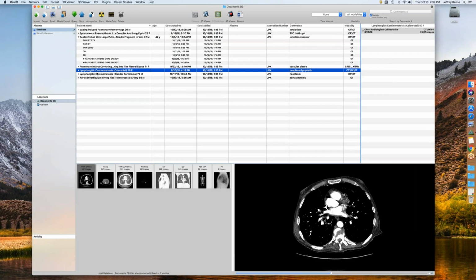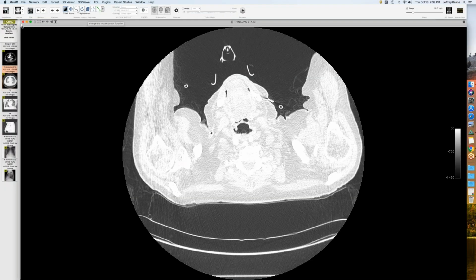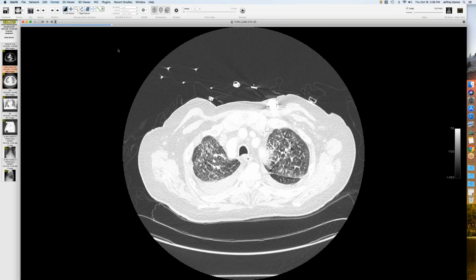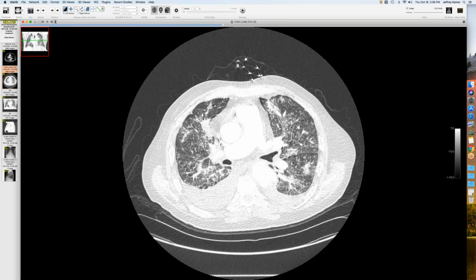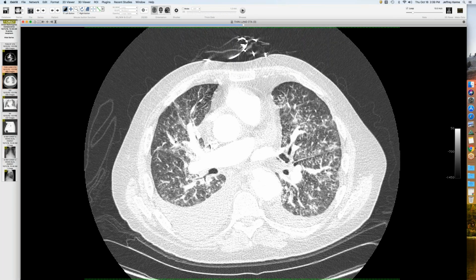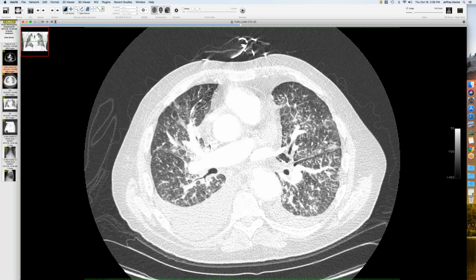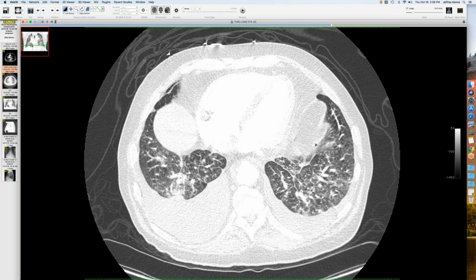And then this is a companion case, and this is one we see less often. This was a patient with a bladder transitional cell cancer who had no chest mets and then shows up like this, very decompensated. This is the more typical appearance when you see the septal lines, but the really shaggy bronchovascular bundles, the dilated veins. Pleural effusion is present not infrequently.